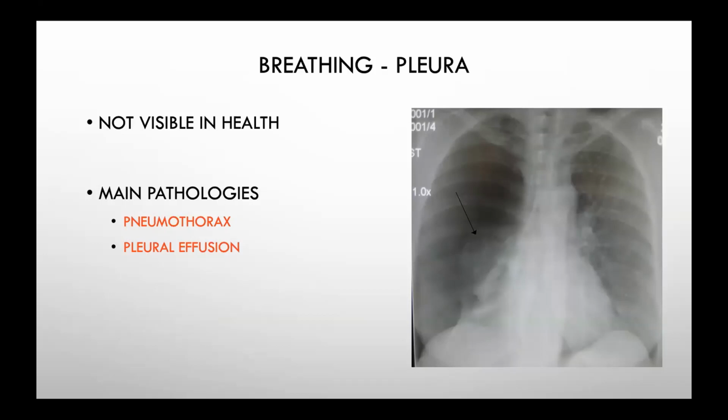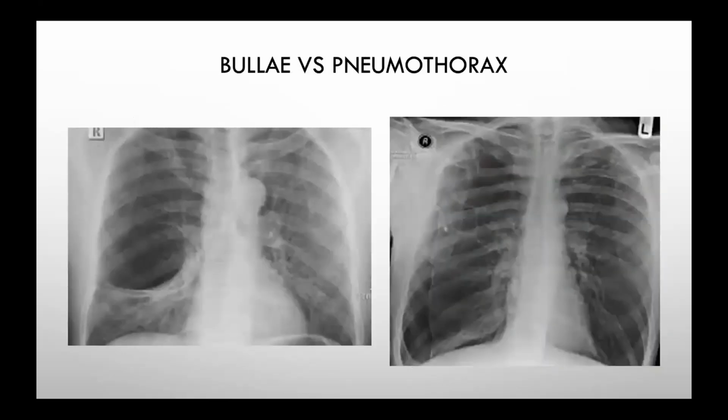With a pneumothorax, it's always really important to look for what we saw on one of the first slides, which is if you see a pneumothorax, look straight for the trachea and work out how bad the pneumothorax really is, how urgently you need to intervene. So once you see this, you can see quite nicely a pneumothorax here. Have a look at the trachea. And pleural effusion, and probably another note on pneumothorax is be really, really careful about COPD, bullous COPD, and pneumothoraces.